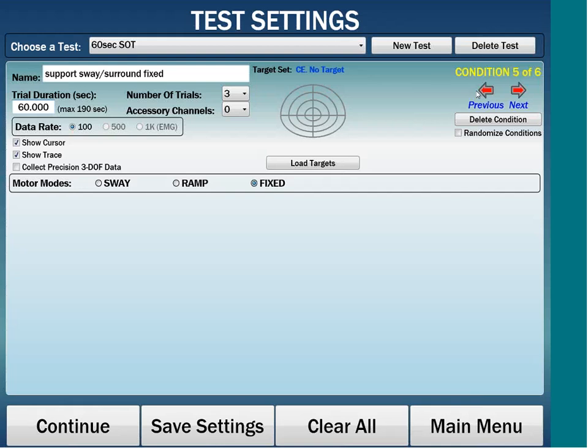Auto-export trials. This functionality will initiate exporting of your trials right after you choose to save your trial, using the export options you had previously selected. That basically covers the functionality of the research module. If you have any questions, we will gladly accept them and create a part 2 of this presentation.